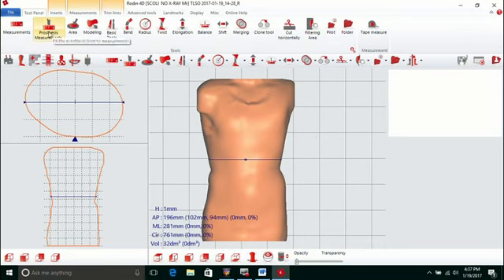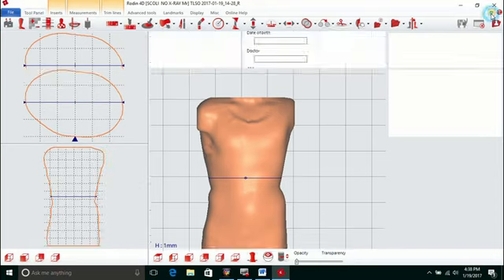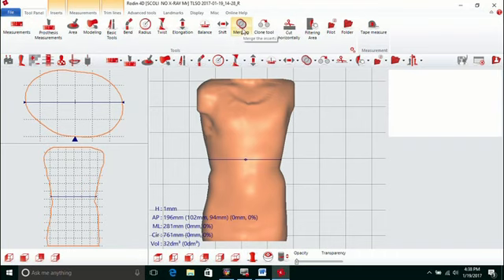Alrighty, your tools. Icon based. Top row also has the name of the tool underneath each tool. Once you get familiar with the tools, which ones you like to use, you can actually, in the upper right, there's a little arrow. You can click on that. That takes away the labeled icons and just gives you the smaller version. So once you get familiar, you can minimize that and actually have a larger modification screen. For just starting out, you can also hover your cursor over each tool, and that will also identify which tool.